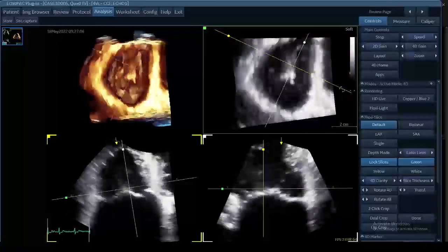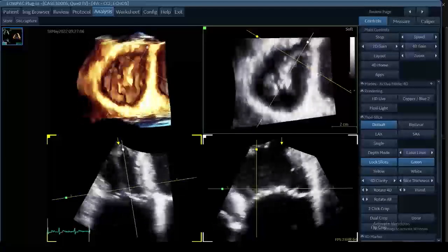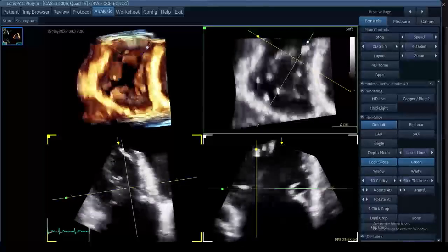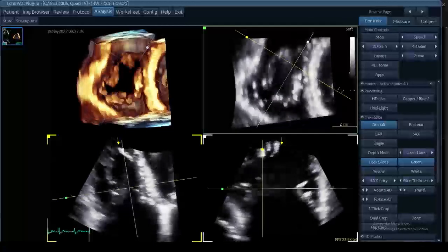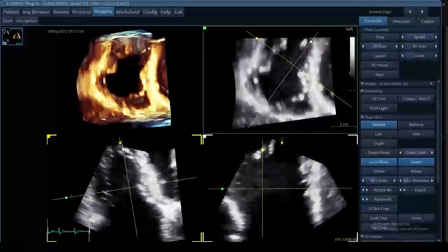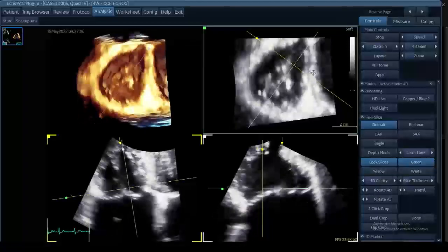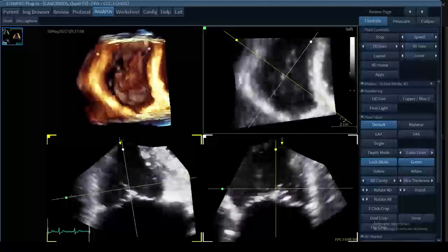So if, for example, we want to do edge-to-edge repair and start near the septal anterior commissure, that yellow plane would be all the way up near the septal anterior commissure, and this is what our leaflet anatomy looks like. I can actually do a sweep. If we were doing this live, we could be adding color on and off, but we can sweep starting anterior and then slowly moving this plane posterior, and at each level looking for TR and also looking at leaflet anatomy.